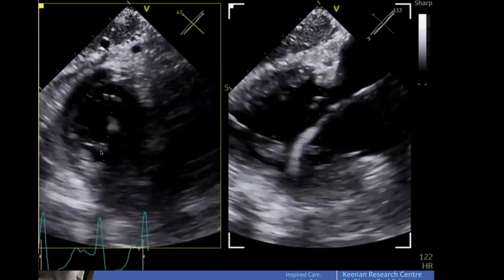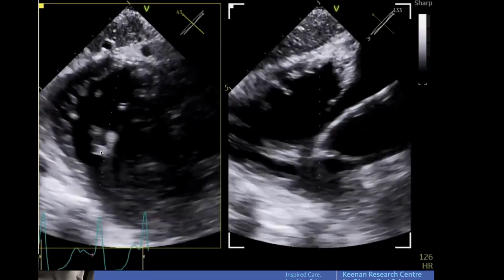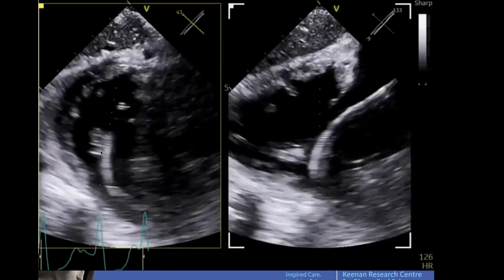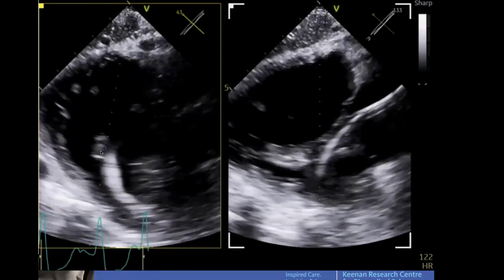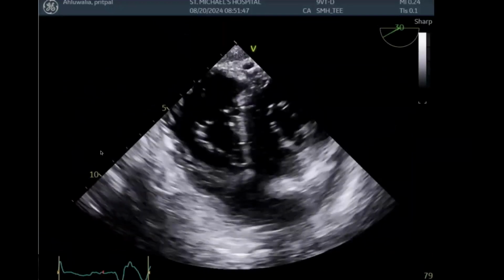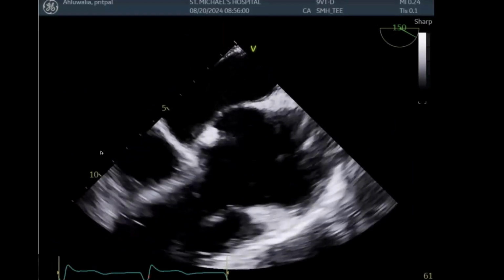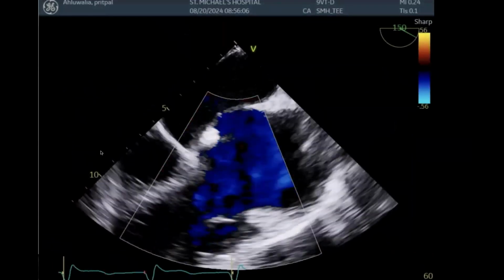If you had to guess here, is there lead-leaflet interaction? Is it interacting with the subvalvular apparatus there? Maybe on the right side, is it touching one of the chordae or the papillary muscle? Hard to say, right? It's not obvious. And in this case, the lead was taken out. Guess what? Still left with a big central coaptation gap. As you can see here, the leaflets are very, very tethered, which you can probably tell even on the first imaging that I showed you, but severe TR.